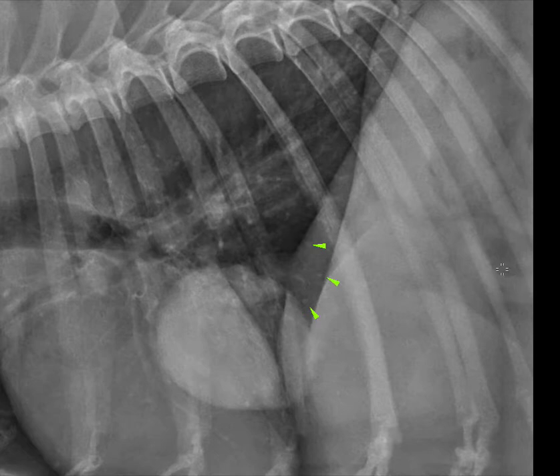If we were to compare that to something that may well be a pulmonary blood vessel, let me show you the difference. Here you can see I'm tracing a pulmonary blood vessel, and at this point here, there's a branch from that blood vessel that goes dorsally. Do you see how adjacent to that branch, there's a soft tissue feature that's round? That is much more likely to be a pulmonary blood vessel end on. These ones, however, have the features consistent with an osteoma.